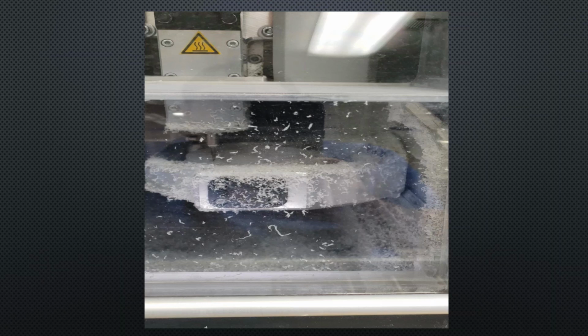And so those things combined, when I saw this mill, or if you have a mill that's similar to that, the chunks got up in that little magnetic cradle, and when they went to put the tool back, it just didn't sit in there quite right. When I went back to pick up that burr, that tool, it didn't pick it up right and caused some problems. So I don't think it would be a problem if they had the proper suction and all the pieces still attached to their mill.